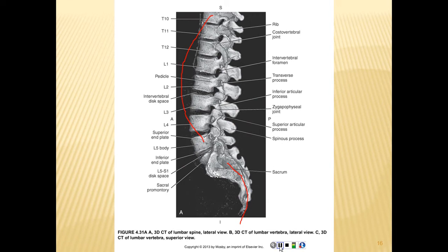The entire weight of the upper body is transferred from the 5th lumbar vertebra to the base of the sacrum across the L5-S1 vertebral disc, and that's why many times there's a subluxation of the L5-S1. That's why particular attention must be paid to the L5-S1. And in some facilities, you will be called to do an oblique projection, axial projection through L5-S1.